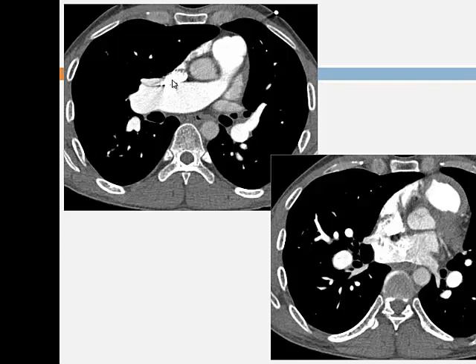Sinus venosus defect, yeah? So traditionally the superior sinus venosus defect, and this is what you're seeing here. So remember, ASDs, unlike VSDs, cause right heart dilatation. Usually the majority of VSDs are in the perimembranous portion of the septum. Next time we'll get onto the CT, have a look at the relationship of the perimembranous septum to the outflow tract, the pulmonary outflow tract.